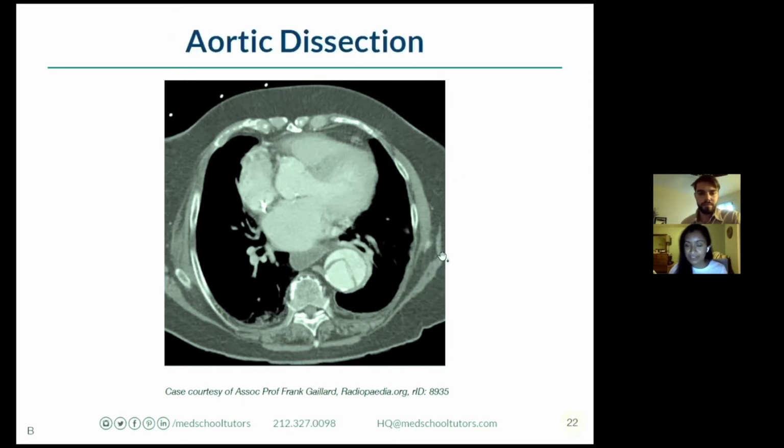So yeah, great. And so big things here. For those of you who were not sure, this is an aortic dissection, right? So here we see, again, use my tricks.